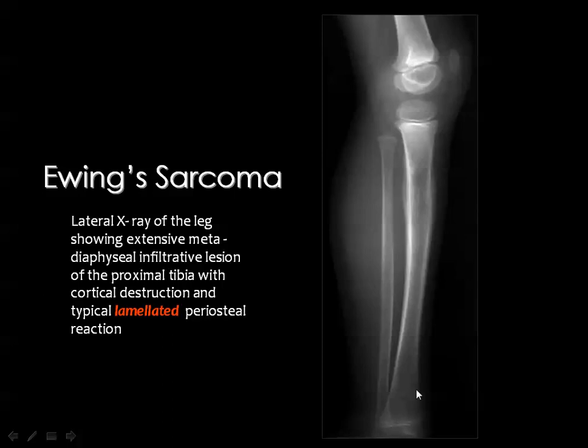Then be careful that Ewing sarcoma may clinically simulate osteomyelitis. This tumor is very vascular. Then whenever it involves the tibia, for example, the leg will be swollen, it will be hot, it may be red, giving similar criteria of inflammation. And the changes of Ewing sarcoma may be subtle in the plain X-ray and may be mistaken for osteomyelitis. Then be careful of this.